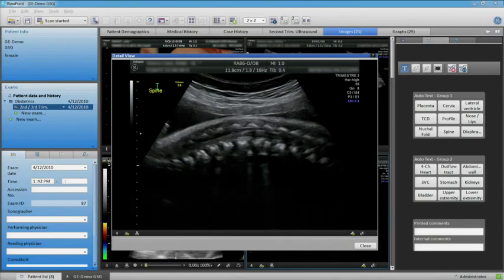For free text annotations, you must first type the annotation text, and then click once more with the mouse to end the text input. To clear all annotations, click the Clear Annotations button. To end the annotation mode, click the End Annotation Mode button in the Annotations tab.